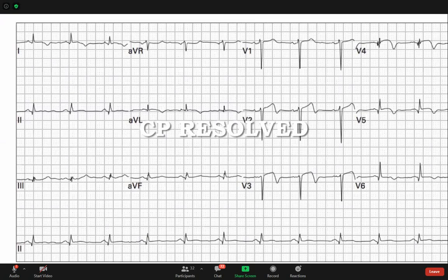Is P have normal morphology? نورمال. وعندك ساينس صح ولا لا؟ طيب الساينس الحين كم الريتم؟ نورمال ريتم دكتور. صحيح. وش الريت؟ مو واضح ما اقدر احسبها. لا الريت تحسبها من الار ويف. فقلنا لما تشوف من R to R. هذا 1 big square 300، 150، 100 يعني تقريبا 75. So you have normal sinus rhythm.